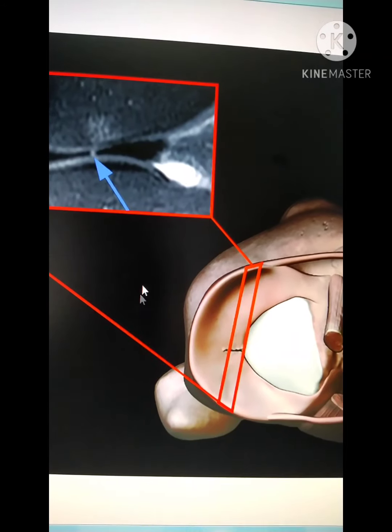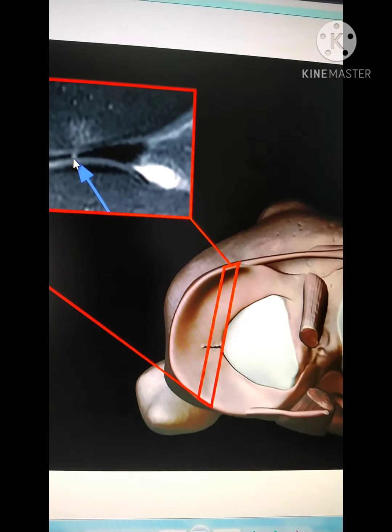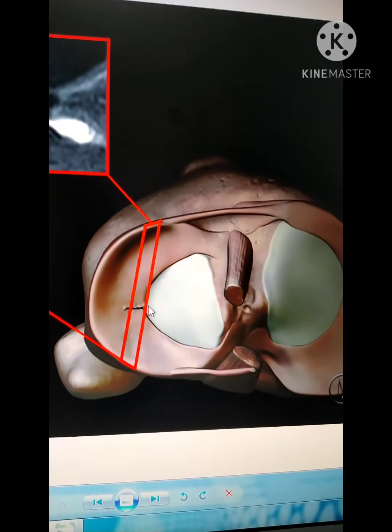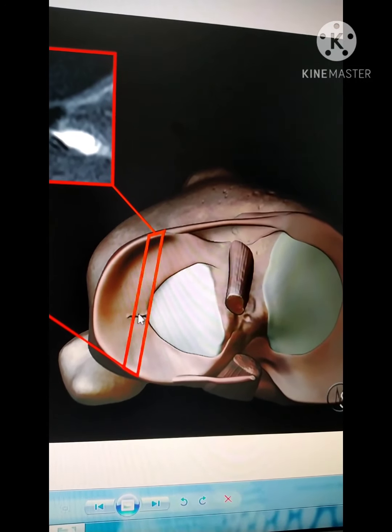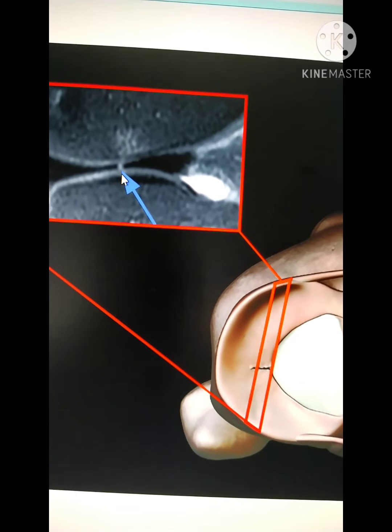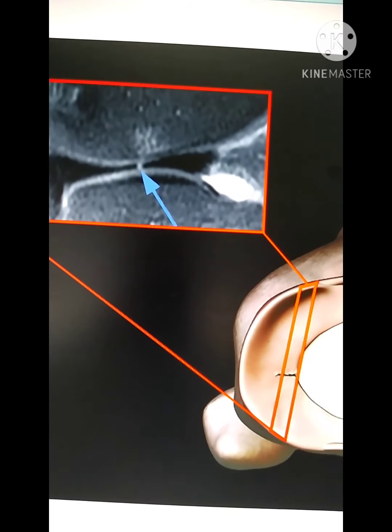Next, what you see is called a radial tear. Okay. So a radial tear always comes from inside out. When you see from here, see like here, this is the inside of the meniscus. So it's from inside to the outside. This is called a radial tear. So this is how it will be seen in MRI findings. Fine. The next.